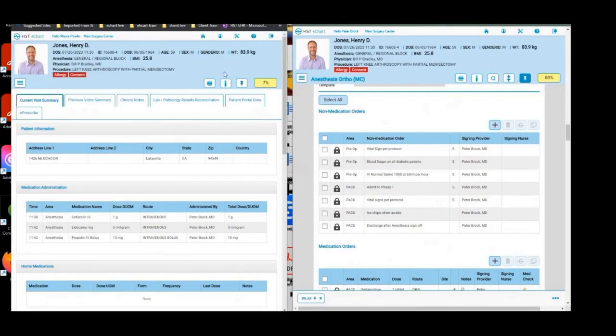So you see here, I'm logged into the same patient. Here I am logged in as myself. Here I am logged in as the anesthesia provider.